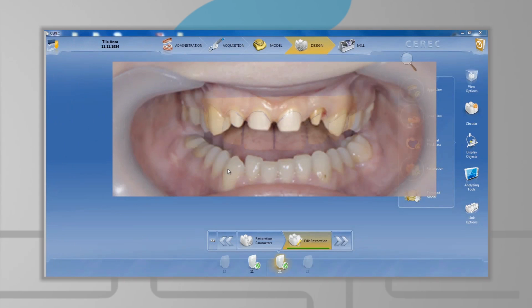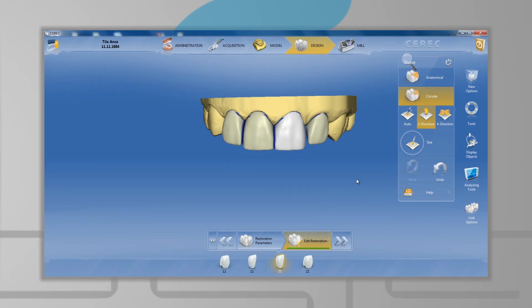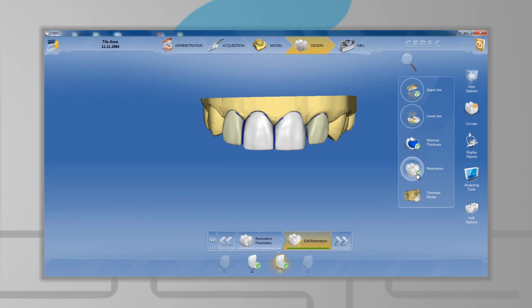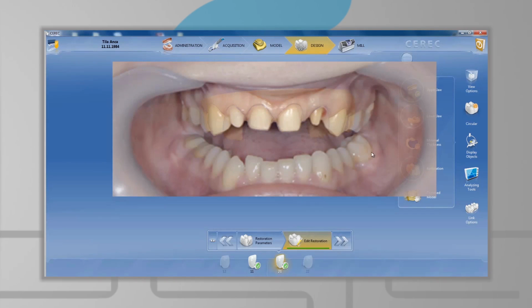Now you can modify the position and rotate the 3D model so it matches the 2D image perfectly. The gingival margins, midline papilla, and front teeth should overlap precisely. For an easier overlap of the teeth in the 3D model and 2D image, you should hide the teeth initially designed with a CAD/CAM application. After calibrating the two images, the CAD/CAM model is set according to the horizontal plan of the face.